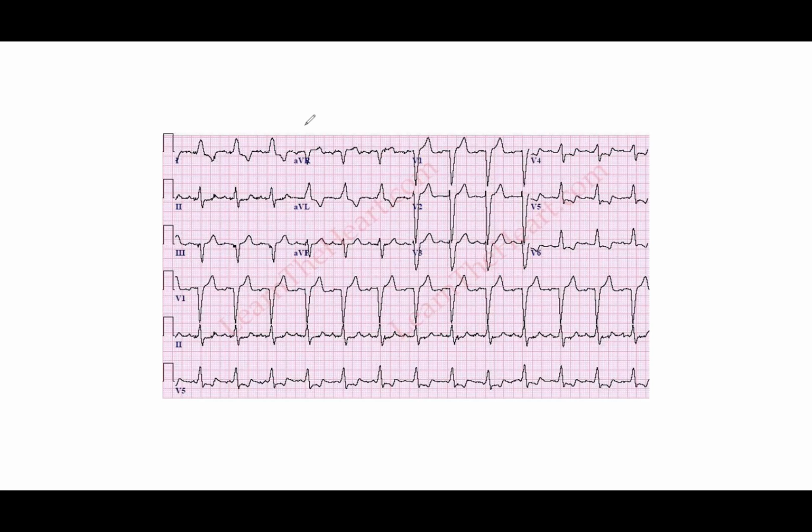Well, let's find out. So remember, for our bundle branch blocks, we go to V1, lead 1, V6, okay? So if V1 is a negative deflection, lead 1 has an R wave only, V6 has pretty much R wave only, no Qs, right?